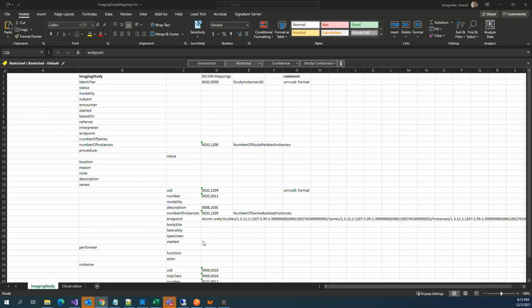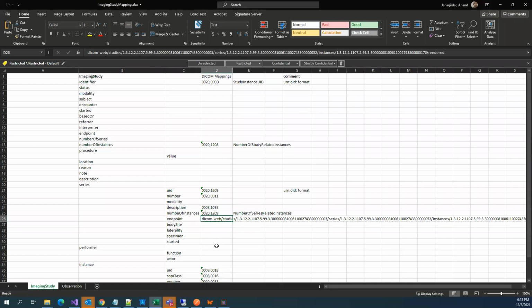Means they first establish an OAuth based thing, they get the access token and all, and then this request will be hit with that bearer token, and the application will take care of that. Right now, with Orthanc and all, you can directly hit and get that. Okay. So I think for the Connectathon, we wouldn't go very deep into that.